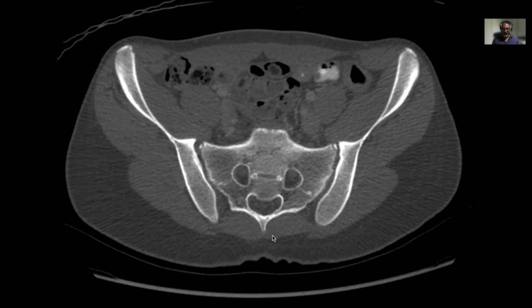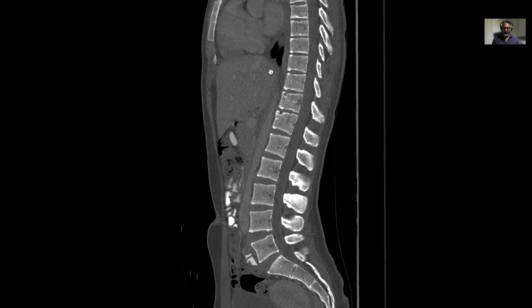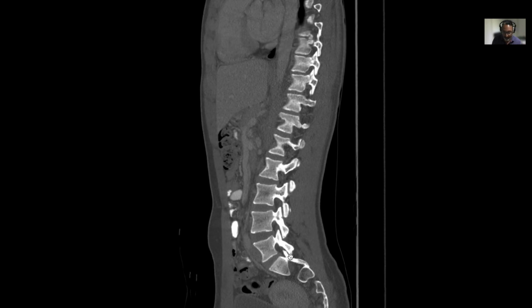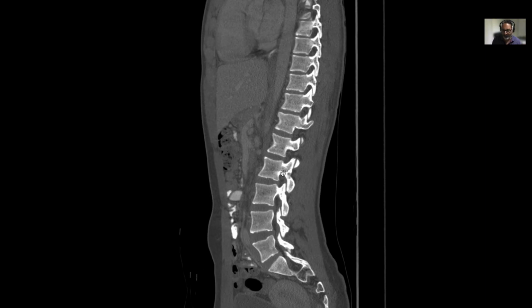If you move laterally, do you see that? These are your intervertebral foramina. This is where the spinal nerves are coming out of. So if there is a complaint of sensation loss or weakness in the lower limb, then these lumbar intervertebral foramina have to be viewed, and you have to look at them to make sure that they look normal in position and size.